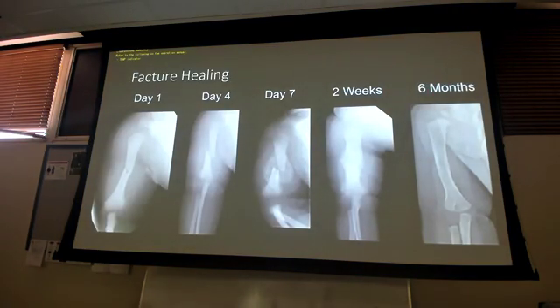Healing process. Right? Now don't let this fool you. This is a pediatric patient. How do we know it's pediatric? I'm missing like bones and joints and stuff. They're not just missing, they're little kids. They haven't come back together yet.